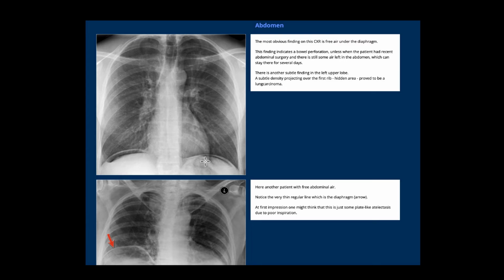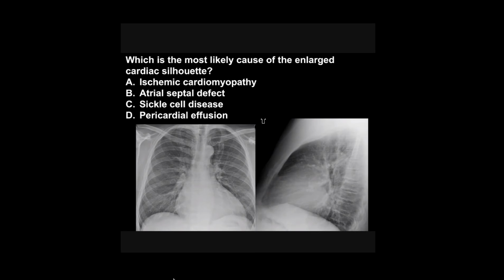And these are critical findings, especially when a patient has not had surgery recently, and we have to contact the clinicians about this right away. And so here's another patient with some free air. This is something that you just want to get in the habit of looking for and pointing out all the time. So this is one last case as we finish up here.